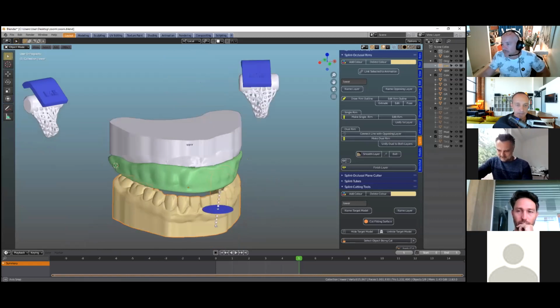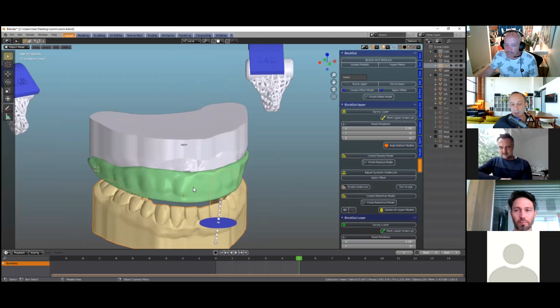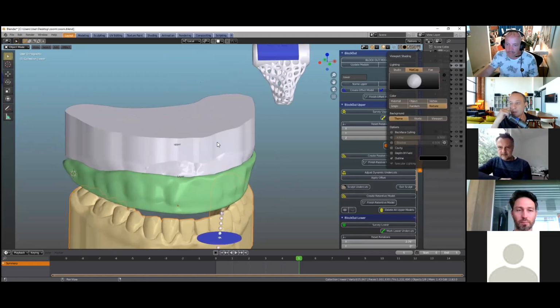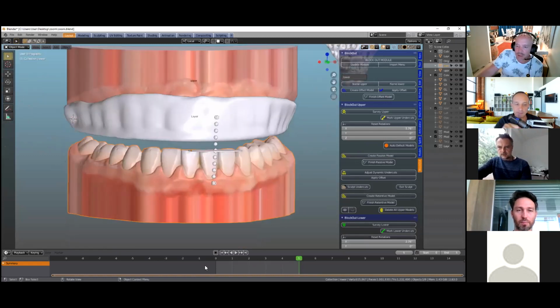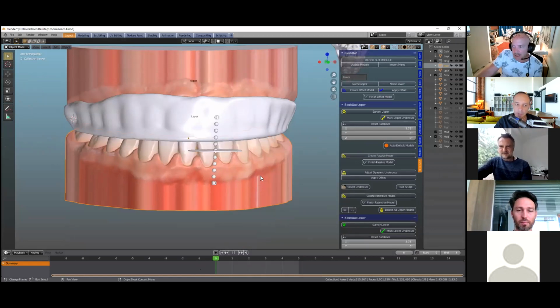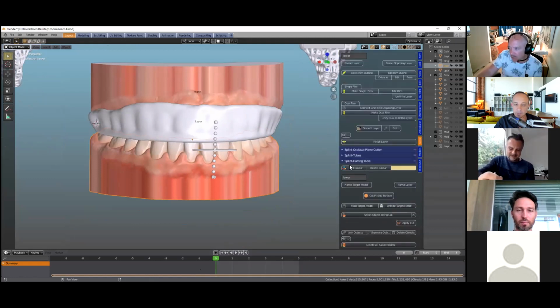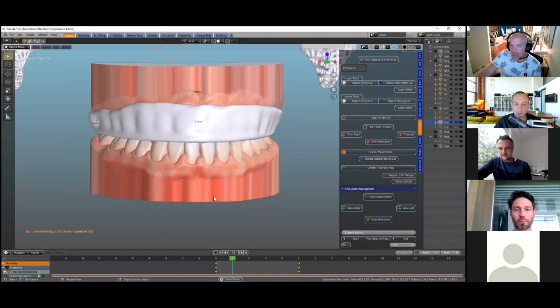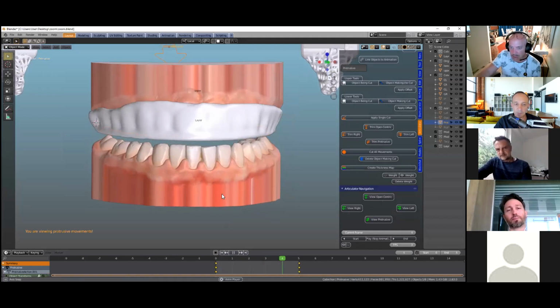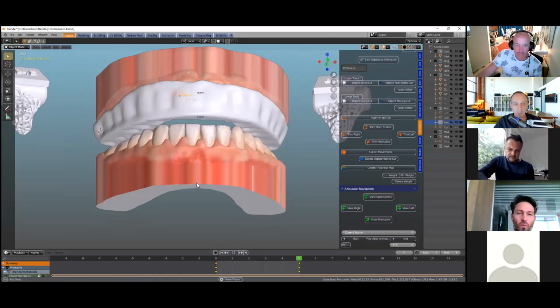Okay. Good. To export it, you just select the model, the layer, and off you go. Yeah, that's right. So that's basically it. I'll just animate this one more time so we can have a quick view of how this thing actually looks. So in the articulator, we set it to play. We can play the animation, and there we go, left, right, whatever.